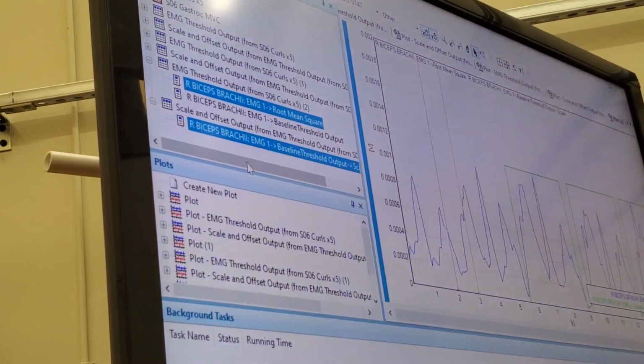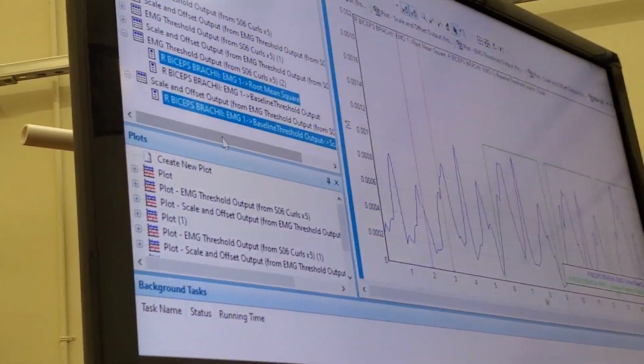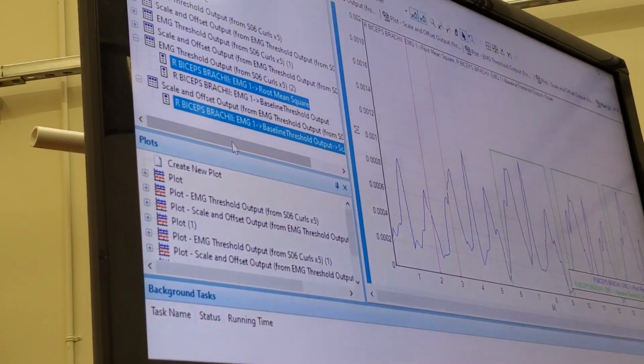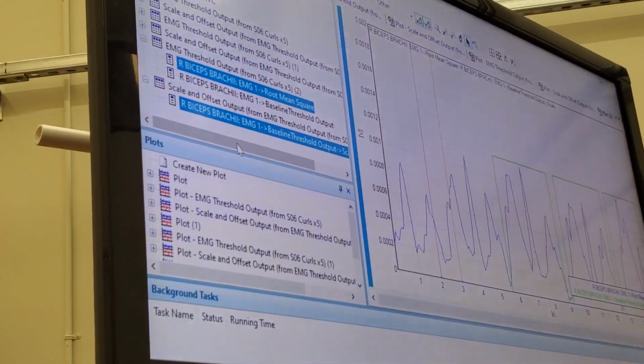Hey, so does it mean it recorded 3 curves? Say it one more time. So there are 3 green blocks, right? Does it mean 3 curves?